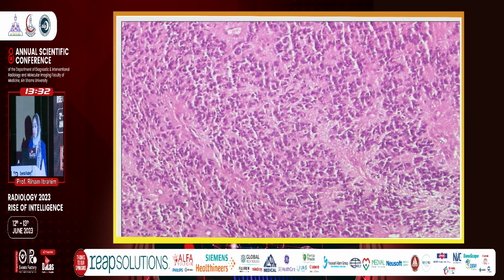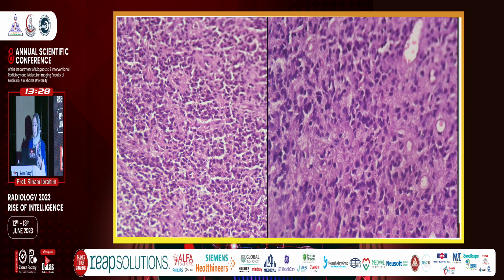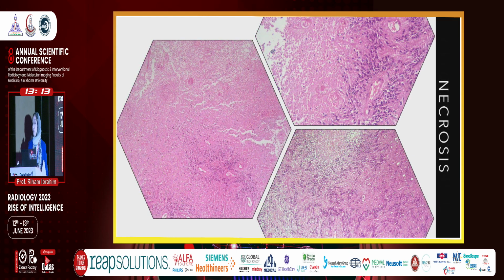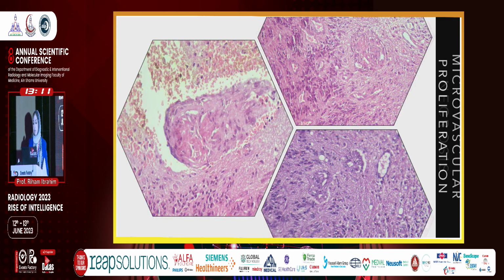These are other areas of the tumor. It becomes hypercellular in other areas. Again, in other areas that you can see here, we start to have more vague rosette formation. When we go for assessment of high-grade features, this tumor had high-grade features focally, like high mitotic activity, necrosis areas with palisading quality, and microvascular proliferation also.